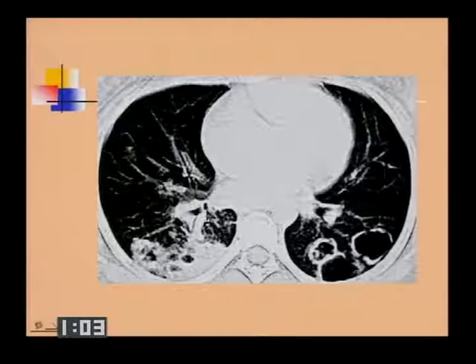And on the CT, you can see the nodules and the areas of confluent density. These are actually treated surgically. If the child has so many that the surgery is going to be devastating in terms of respiratory function, they're given actual chemotherapy with methotrexate.